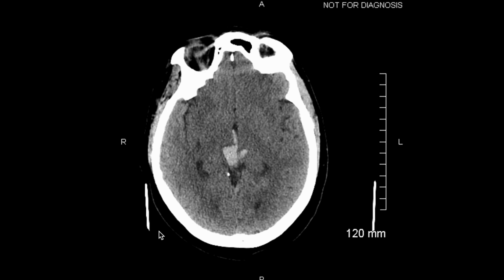So what do we have here? This actually was called down as a code stroke. So essentially we see this almost bilobed, hyperdense structure in the region of the midbrain, and we happen to see even a little bit of extension into the third ventricle. This happened to be an acute intraparenchymal intracranial hemorrhage, a midbrain bleed that happened to have some intraventricular spread within the third ventricle. The other ventricles are not well seen on this particular image, but there was no hydrocephalus.